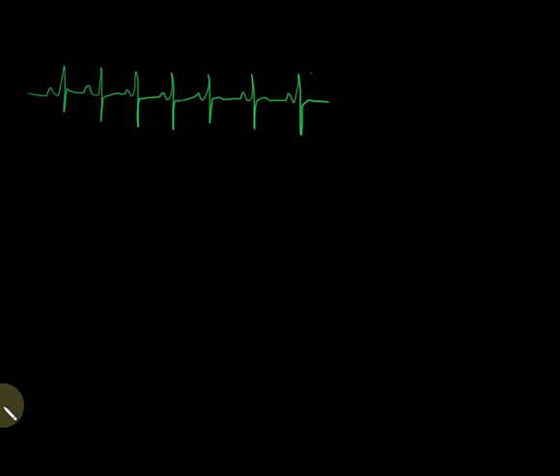So you've got QRS is narrow. P waves are upright, round, and relatively symmetric. I'll admit that they're hand-drawn, so they're not perfectly consistent, but you get the idea. They're pretty consistent on here. So, hand-drawn rhythms on here, it's relatively consistent looking P waves. PR ratio is a 1-to-1.